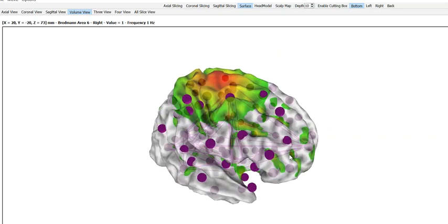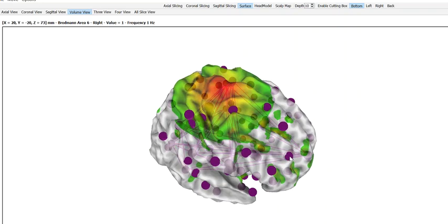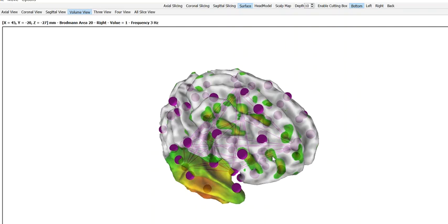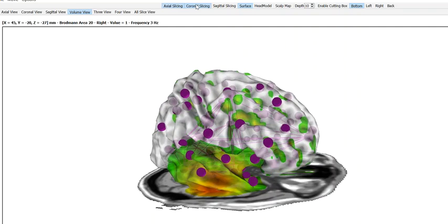For now, this is edited data that has been imported into the NeuroNavigator with swLORETA, and we can move these things around a bit and allow it to take different forms and also have scalp and skull removed or slicing through the brain with all the other various tools that we have.